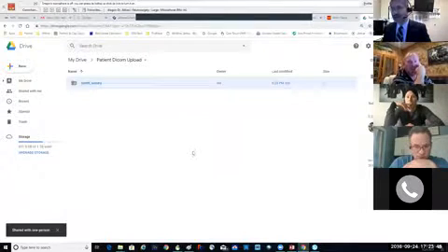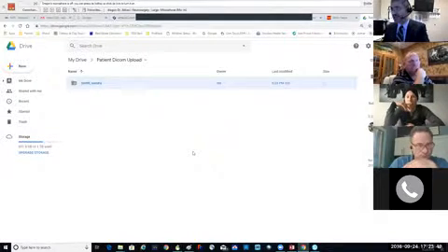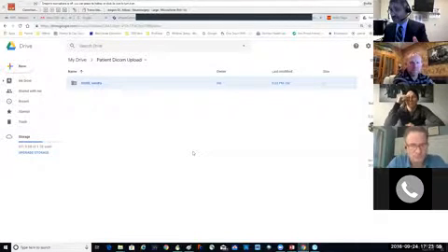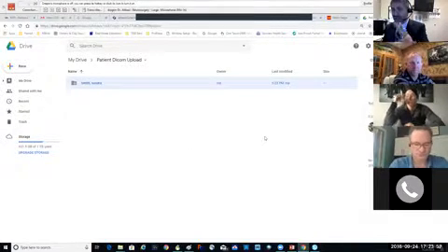So I installed the XIView. On the Google Drive, I gave the patient a directory that she can actually access. And now I can do two things.